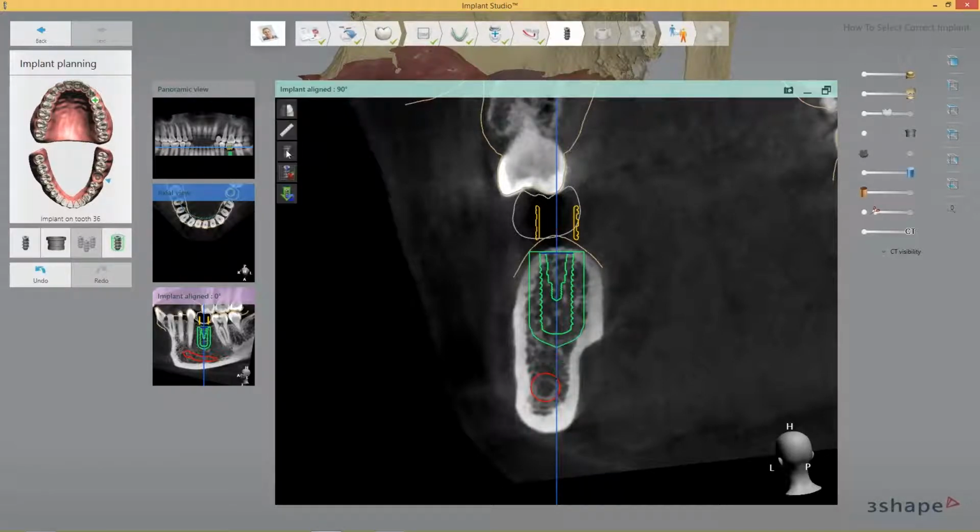So let me just show again, if you go in next to the implant, and we can see here that we have 216, we have almost 1,000 here, it's over 1,000, so it's very good. So I can actually see here I have 787.